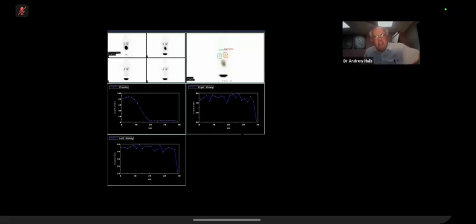Now, this is a test we do occasionally. I would like to ask you about it. We don't do it that often, I suppose. What sense can you make of that?